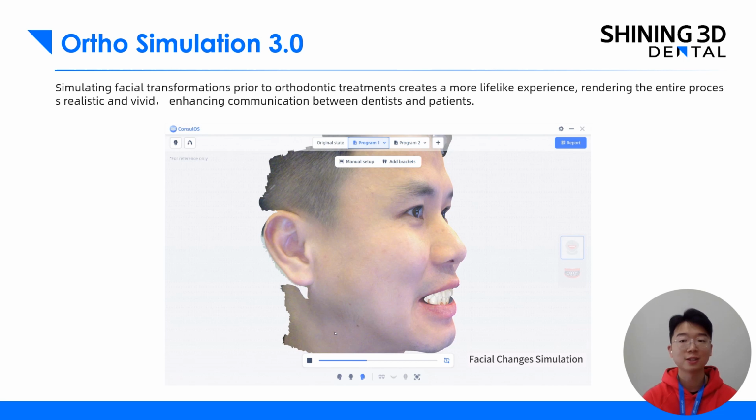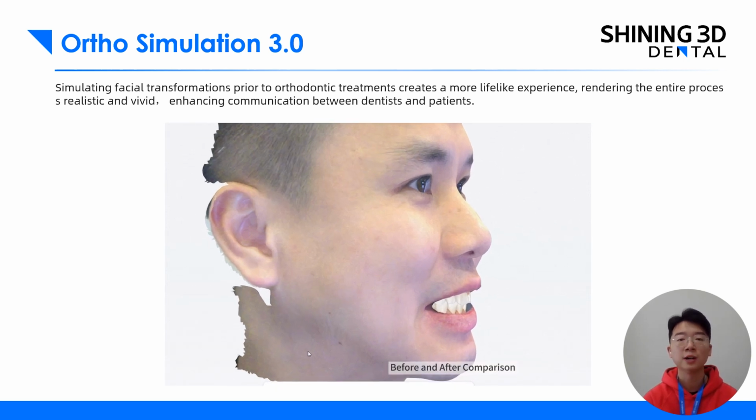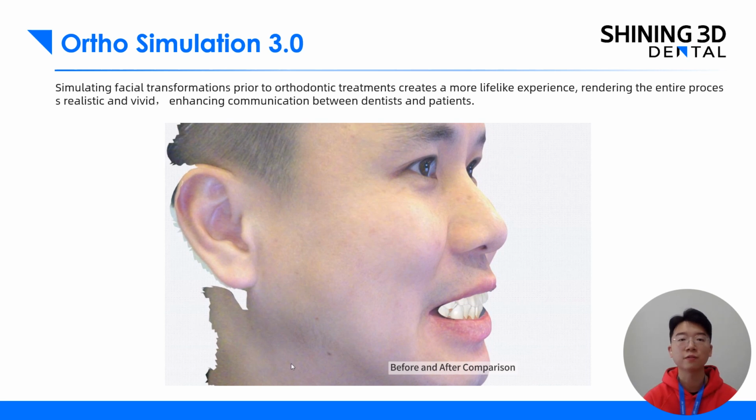As we just mentioned, the old version, the Ortho Simulation, can only simulate the changes that happen in our intraoral scan data. But now, in the Ortho Simulation 3.0, we can simulate not only the changes of our intraoral scan data, but also the face data.